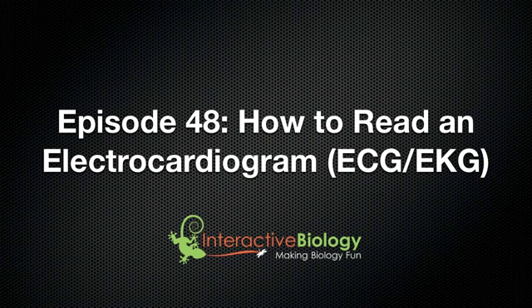My name is Leslie Samuel, and in this episode, episode 48, I'm going to show you how to read an electrocardiogram. For short, it's called ECG or EKG. So let's get right into it.